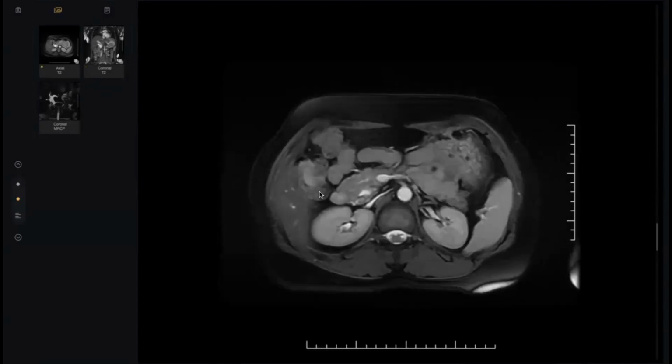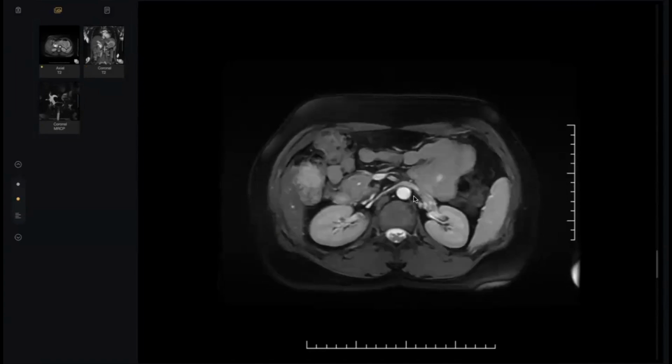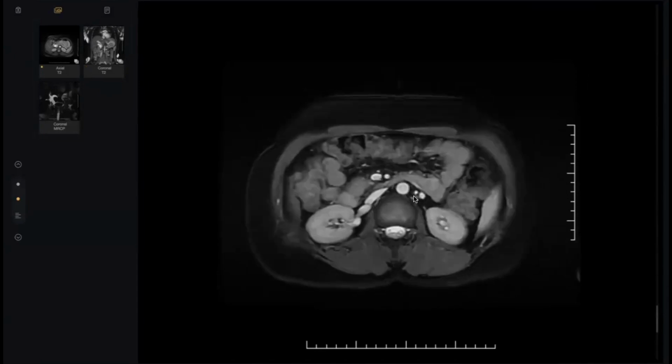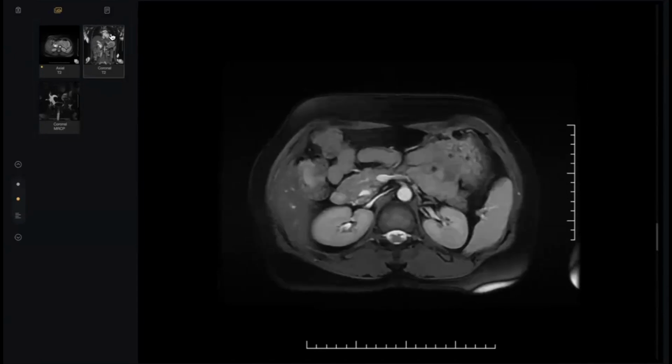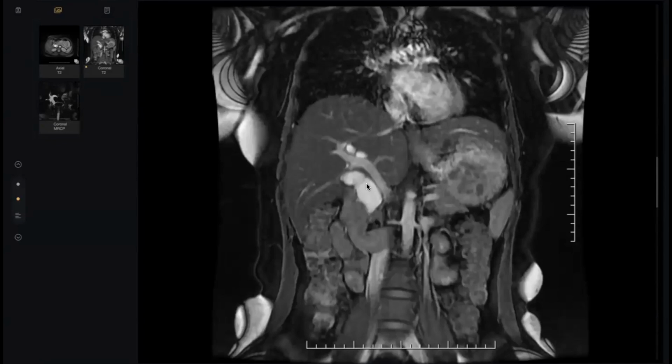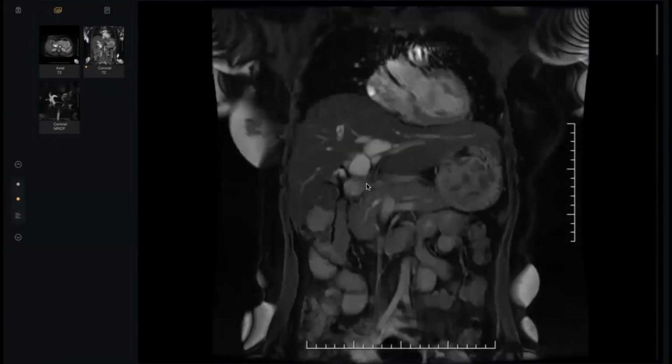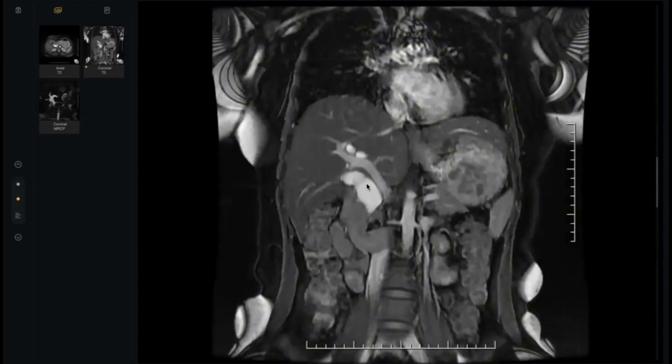Look here. That is its entry into the duodenum here. The distal end is normal. What is your other differential? Then it could be some congenital anomaly showing dilatation of the intra and extrahepatic biliary channels.